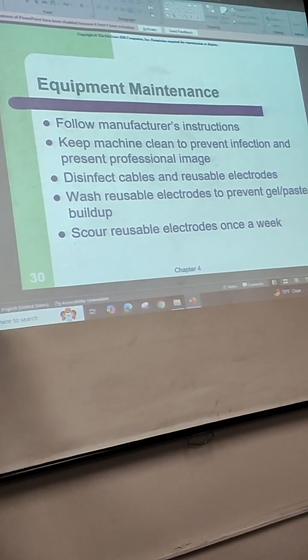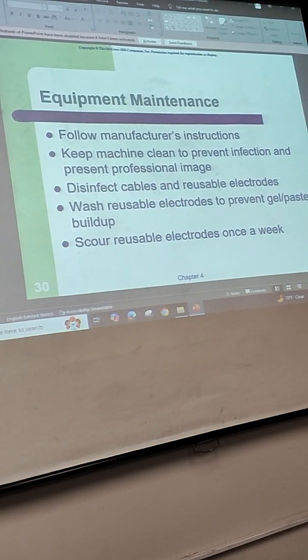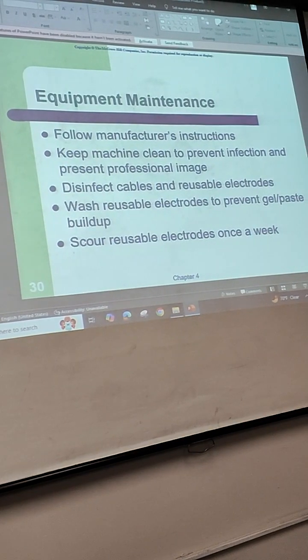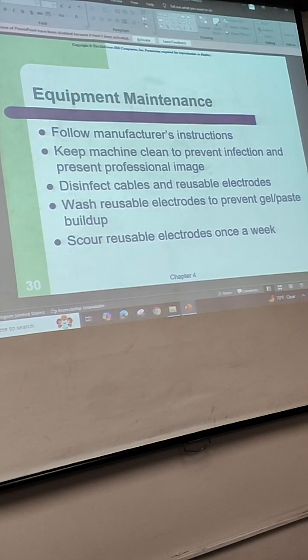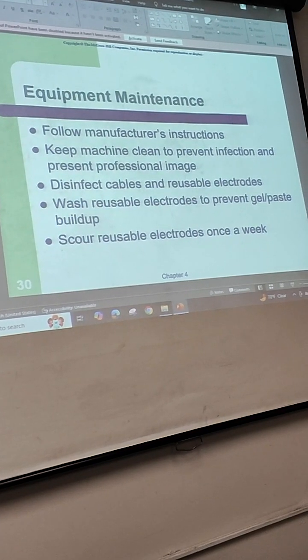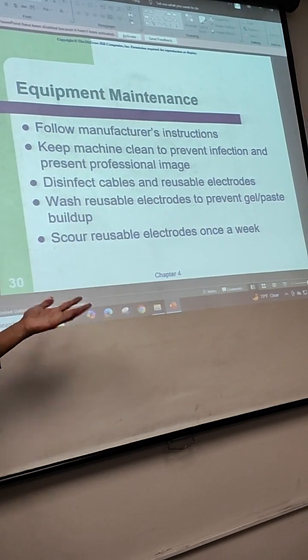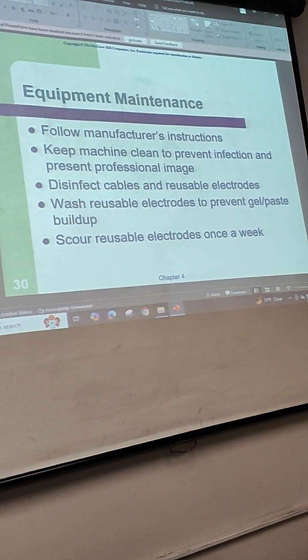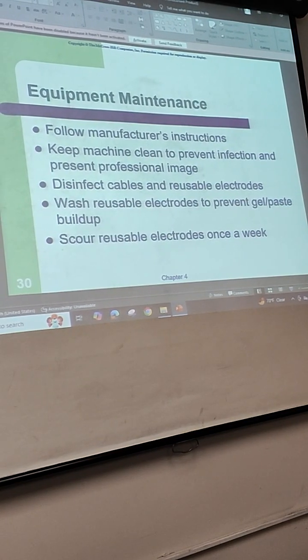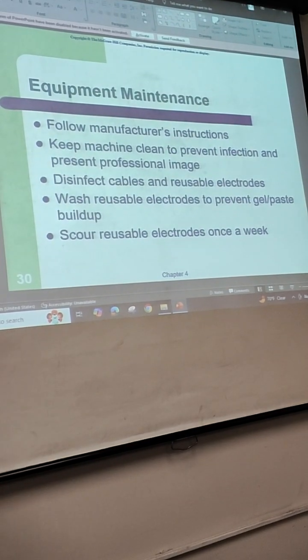But the wires can get a little dirty because of use, because of the handling, right? Because of how you place them. If you just throw them somewhere, these cables get very dirty if we just plug them anywhere and never clean them. Because we are using them on the patient, and we have to put them on the chest and the arms and the legs, they need to look nice and clean, right? So that's basically what it is.